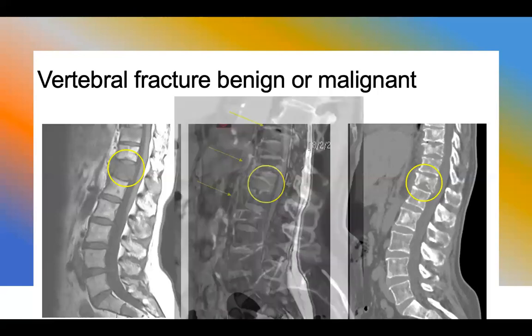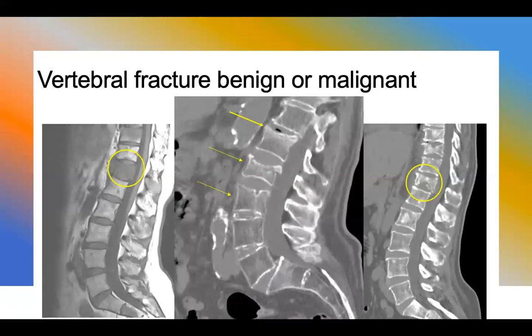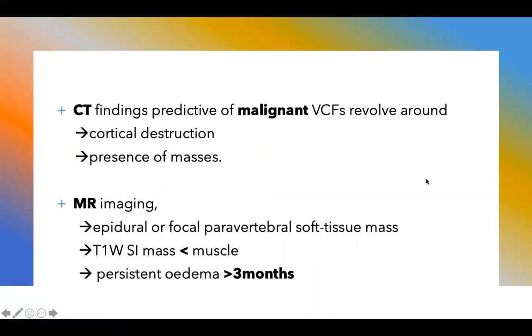These images are in contrast to benign osteoporotic fractures, where we do not see any prevertebral soft tissue, and we actually see quite nicely the fracture plane, quite typical for osteoporotic fracture. No bulging of the posterior elements, and it's really in contradiction with that pathological fracture of the bone infiltration.